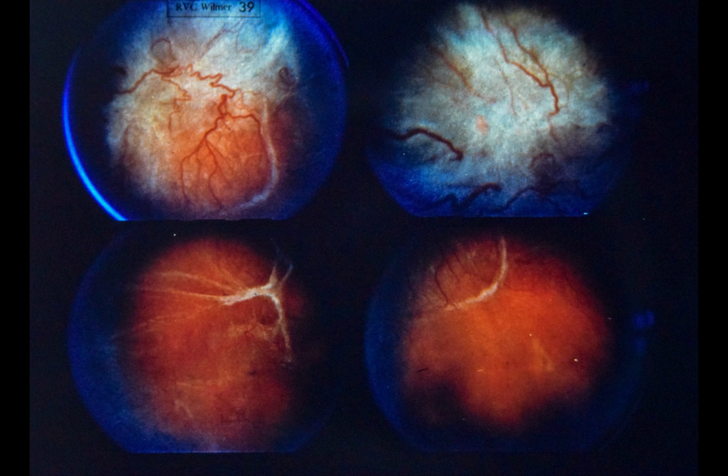Upper left, note advanced disc neovascularization, traction detachment, and vitreous hemorrhage in a photograph taken in the region of the right optic disc. Upper right, note superior temporal fundus, right eye, with marked fibrovascular proliferative retinopathy. Lower left, in photograph taken of macular region, again note marked fibrovascular proliferation and traction detachment. Lower right, photograph of more peripheral area of fundus shows that traction detachment extends out towards equator.